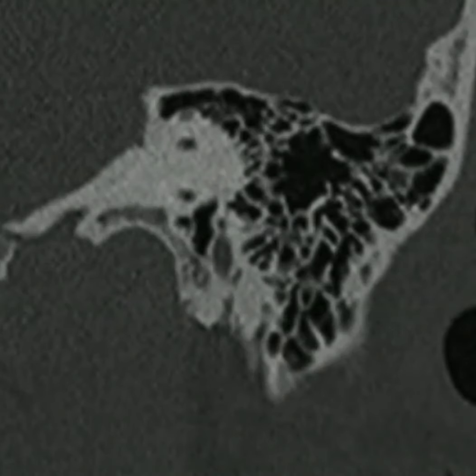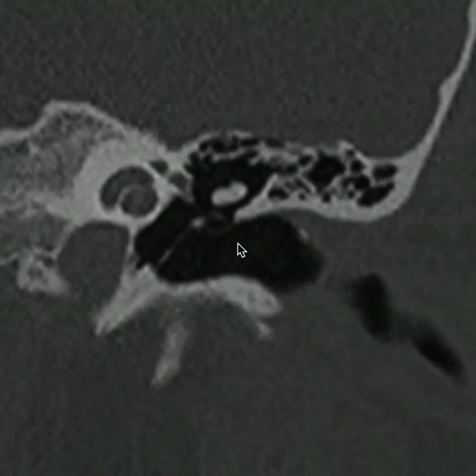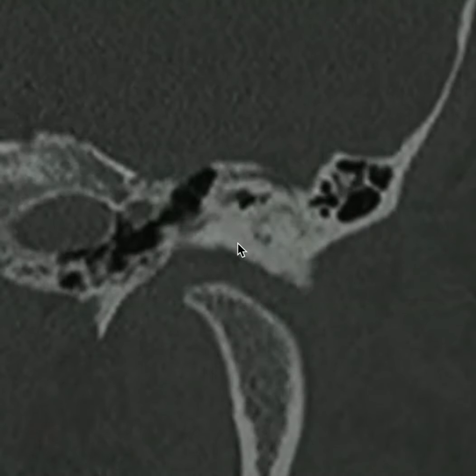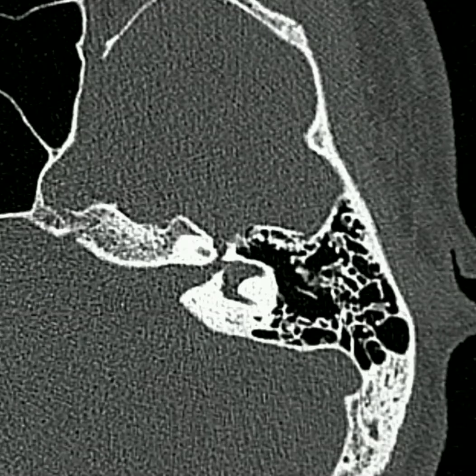This opening right here houses the chorda tympani. The chorda tympani courses superolaterally and anteriorly. So here I'm scrolling anteriorly again to watch this extra canal housing the chorda tympani, and I'll watch the chorda tympani enter the middle ear cavity right here, just behind the tympanic membrane right here. As I go further anteriorly, I'll notice it enter the mandibular fossa by passing through the glaserian or petrotympanic fissure right here. We can also follow the course of the facial nerve on axial CT.